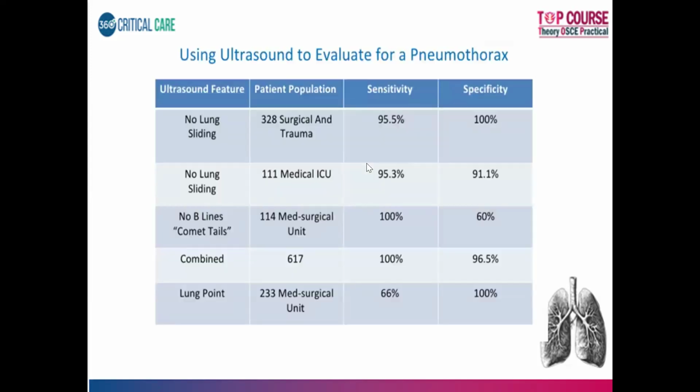So I was telling you earlier, lung sliding, no lung sliding. Lung sliding sometimes can be erroneous also. Absent lung sliding can also be seen in subpleural pathologies like consolidation being present just below the pleura. At that time also you will have absent lung sliding, but that does not amount to the presence of pneumothorax. So that is the reason I told you lung point becomes more specific. But the specificity should always be combined with one or more findings. It should go in an order.